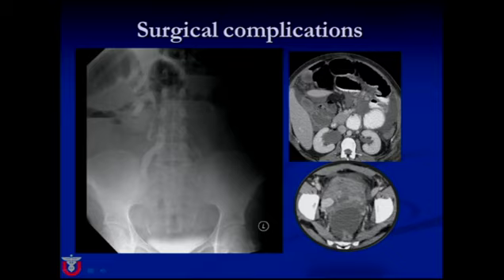She had a CT scan. Here's dilated loops of bowel with ileus. Here's extensive amounts of free fluid in the abdomen. Here's the hydronephrosis on the right. And down in the right hemipelvis, there's this large enhancing mass. And so the question we had is, well, could this be a pseudoaneurysm or an AV fistula?